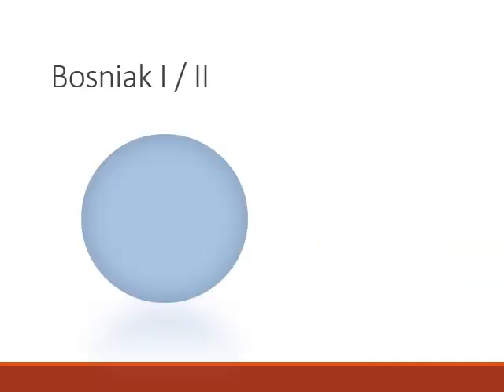Simple cysts, first of all. Cysts are classified according to Mr. Bosniak from 1 to 4. Mr. Bosniak only actually died in 2016, I learned that today. So a Bosniak 1 is a simple cyst. We don't call it a Bosniak 1, we just call it a simple cyst. It has HU values between 0 and 20, a hairline thin wall and no septations, no calcification. That's what they look like. They're benign. You don't need to follow those up.